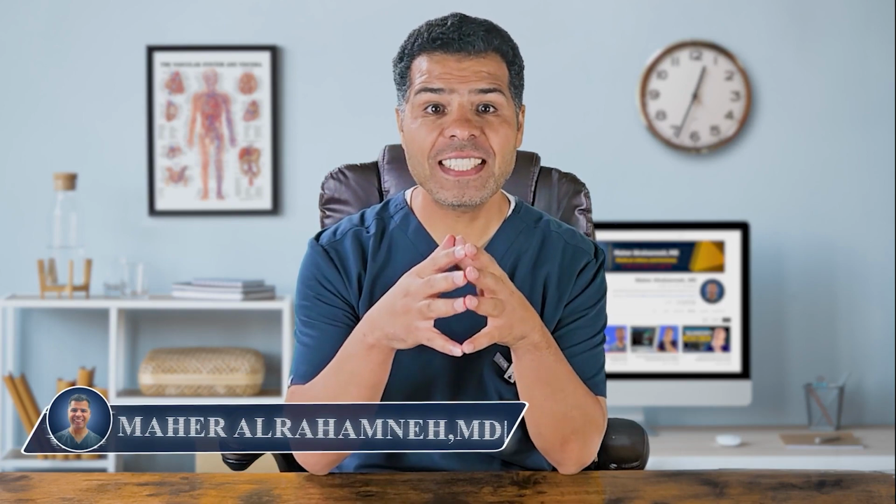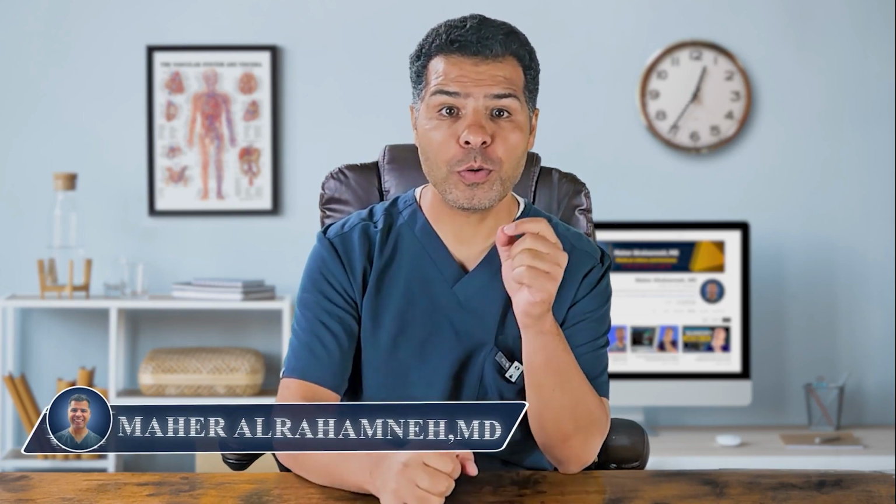8 EKG patterns we cannot afford to miss. These patterns in the right clinical context are suggestive of acute coronary occlusions and require immediate reperfusion therapy without any delay. It's our responsibility to identify these EKG patterns early and save the patients' lives.